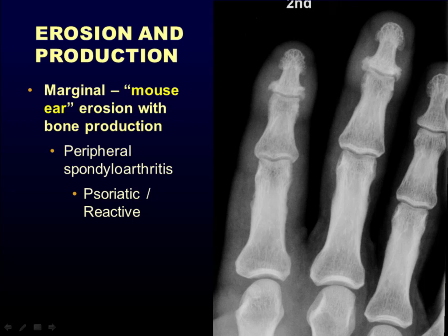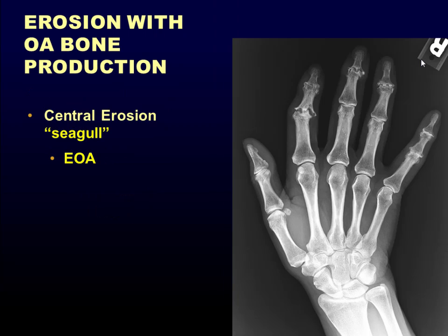Here, an even more exaggerated appearance, where there's proliferative bone formation adjacent to the erosions, where the bone formation is whiskery, new proliferative bone formation at the margins, and you can see a more normal contour to a joint as a comparison of this extra bone formation. And this is all very classic for psoriatic arthropathy. Contrast that with the erosions seen in erosive osteoarthritis.